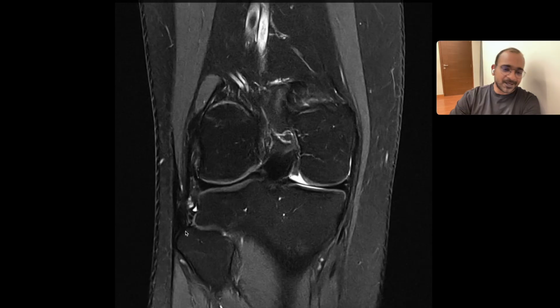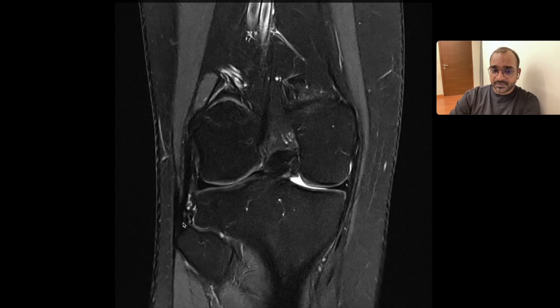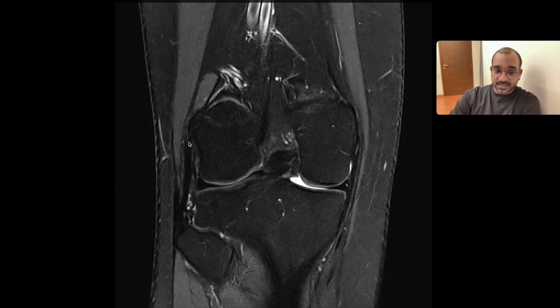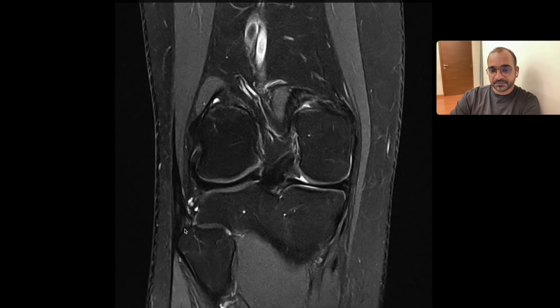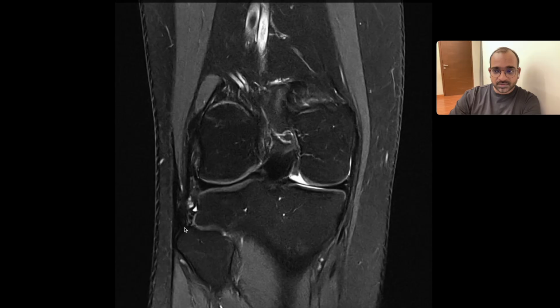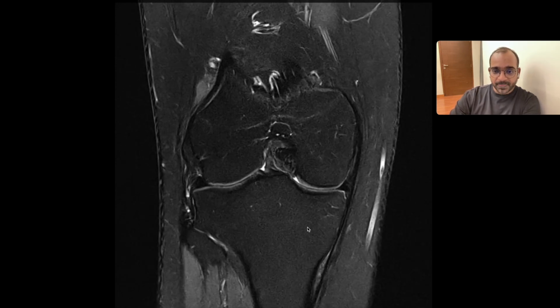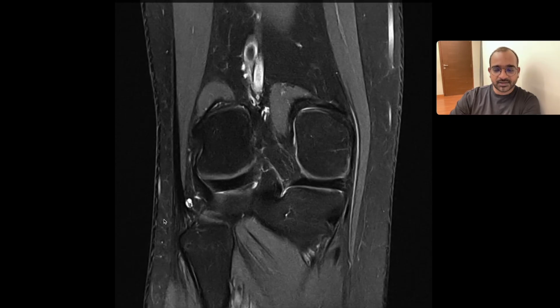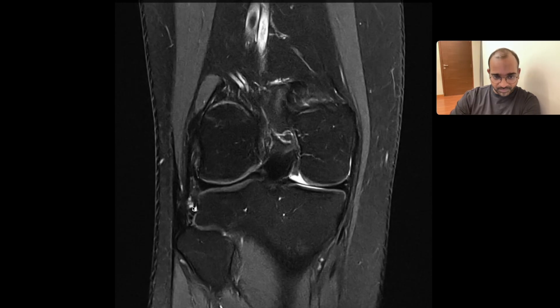So if there is a trauma, we can see if the avulsion is happening at the biceps femoris insertion or the lateral collateral ligament attachment. It can be both also, based on which is taut and which is torn and wavy. Okay, then this is about the lateral aspect. We discussed the muscle on the lateral aspect is biceps femoris, that's tendinous insertion, lateral collateral ligament, popliteofibular ligament.